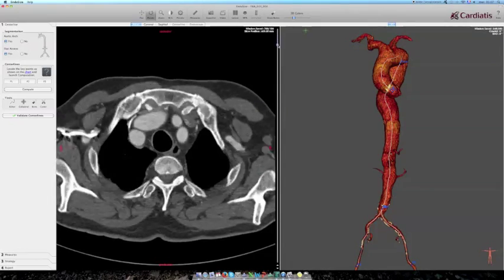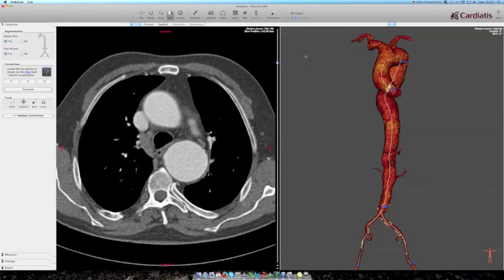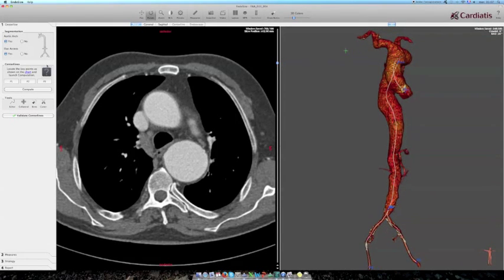The study involves not only the endovascular pathologies, but also the lungs and any other structure that, as referred, can be affected. The study of the 3D is as important as the study of the axial images. Therefore, we define points of interest to show the 3D. P1 shows the beginning, in this case the sinotubular junction, and P2 and P3 are in the iliac arteries. These first points will give us access to know the extent of the lesion that we are studying, or the aorta.